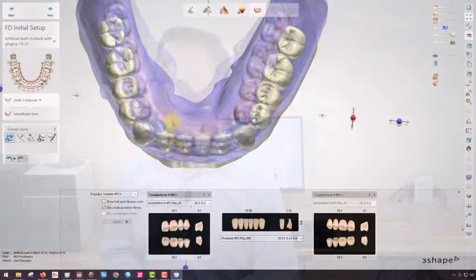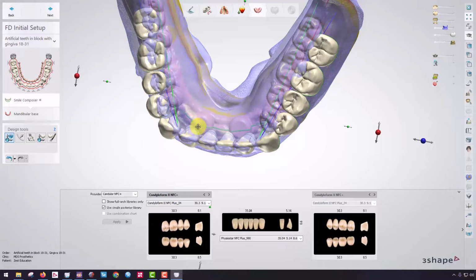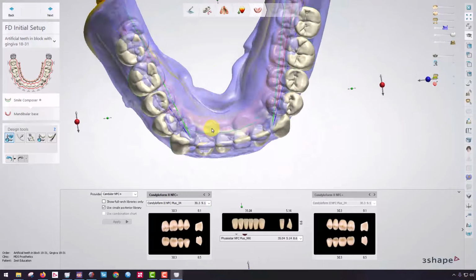Now, I could just ignore the lower completely and just have the opposing arch, meaning the upper, and then match the teeth to it. That gets you pretty close too. So there's lots of different ways how you can go ahead and approach the software application for Locator and Locator Fixed. Now taking a look here at this, I can see across the board this is looking pretty good.